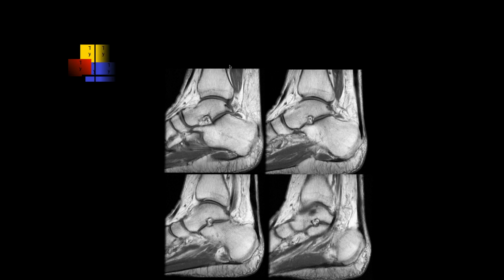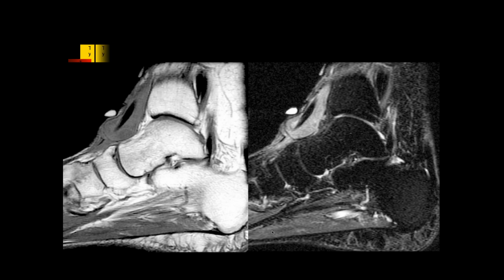So this is just the tibialis anterior tendon, which is not in our typical sagittal plane. Proximally, we'll see it more toward the midline. And as we go distally, it comes more and more medially until it comes down, and one of its attachments is here on the medial bone here. Like so many tendons that come down, it can have multiple attachments here, but the medial cuneiform is its primary attachment most of the time. Not as many as the posterior.